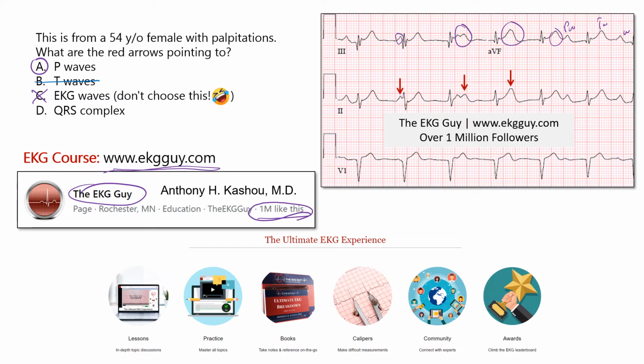All right. The other thing I want to note here is that the ventricular rate is faster than the atrial rate. Okay, we use the P waves to find the atrial rate. So if you look here, these are your P waves. Okay, so I'm going to circle them where they would show up, and notice that the ventricular rate, the QRS complexes, are occurring at a faster rate than the P waves. So a good case that you can see that is here.